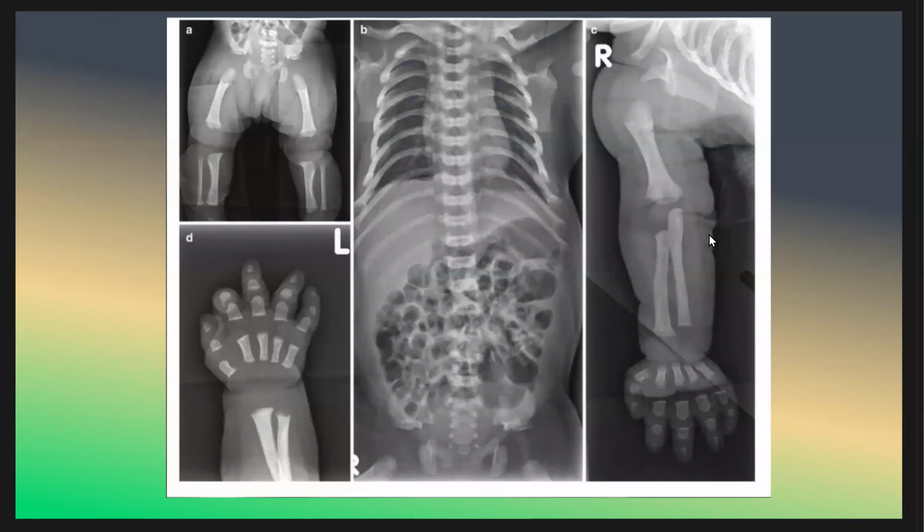Okay, what do you think this patient has? We have multiple views and we have a V-shape, rhizomelic shortening, and decreased diameter of the spinal canal as we move distally. And this is a case of achondroplasia.